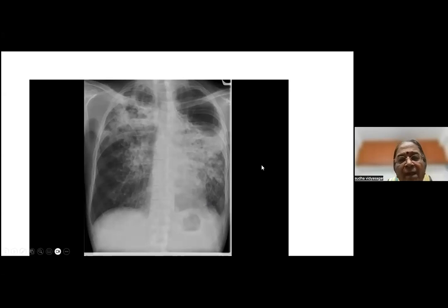What is this showing? A simple X-ray. Okay, cavity where we're calling it a bulla. This one. Okay. What else is there? Left apical bulla. What about the rest? What about all this? Who's going to answer for all this? Right?